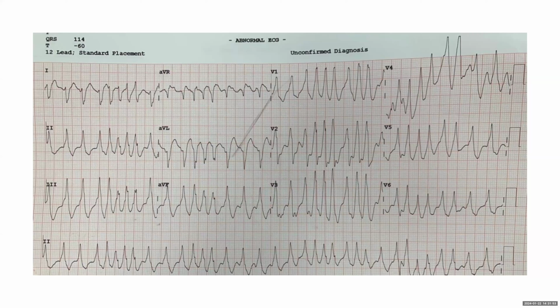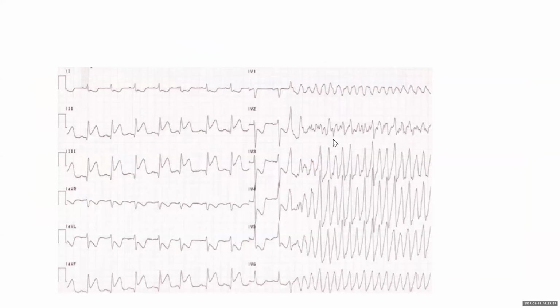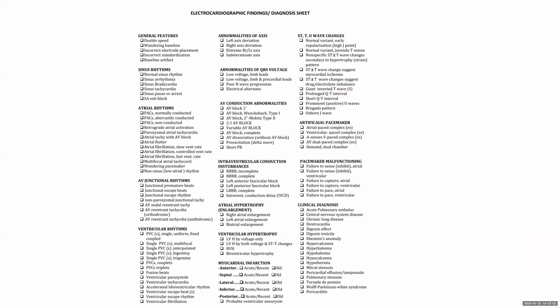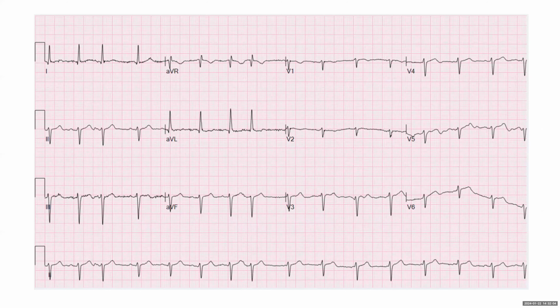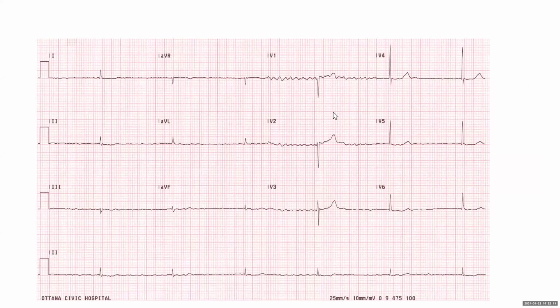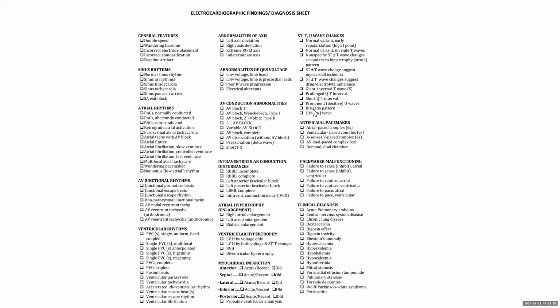to previous examples. Oh, my mouse is not, yeah. Let's look at one of the old AFibs. Yeah, for example here, if there are lots of QRSs, you might see some of these and think that they're P waves, but they're not. So there are no P waves.